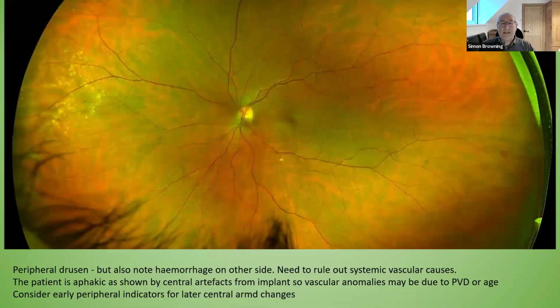This is again the sort of retina you'll see in an older person. There are a lot of telltale giveaway signs here. This is soft drusen, far more amorphous in its appearance, and you can see how these coalesce to begin to form much larger plaques out in the periphery. But you'll also see scattered other drusen. There are giveaways in this image that this is an older patient.